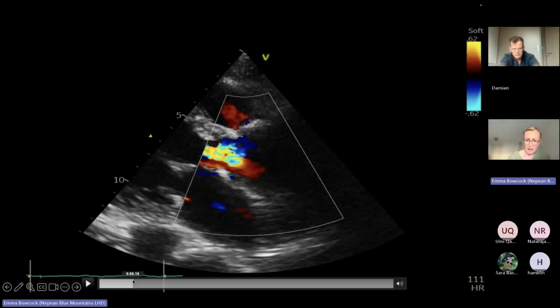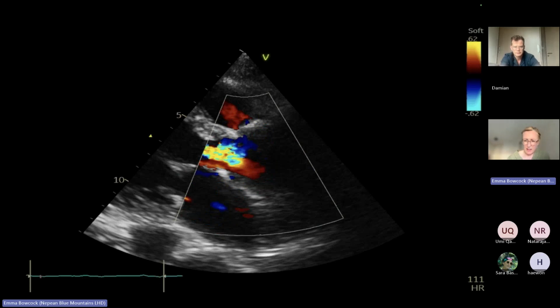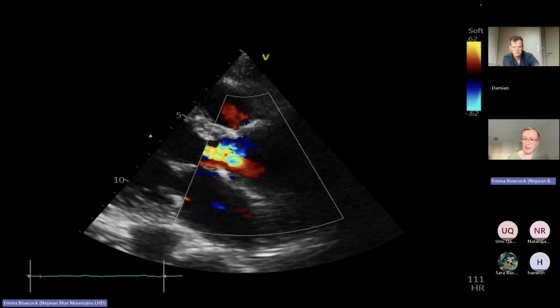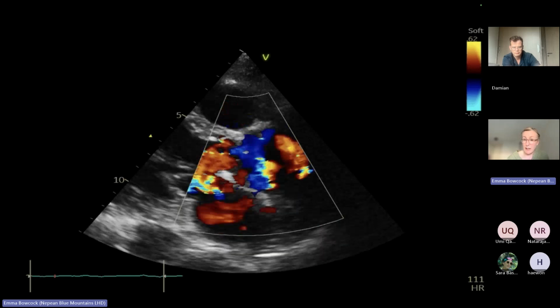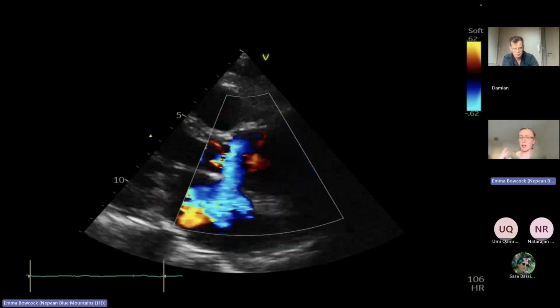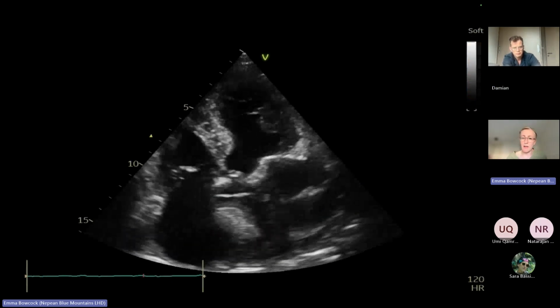So there in diastole, you've got that flow convergence. It's sort of eccentric and chaotic and a bit all over the place, isn't it? It's filling a lot of the LVOT, more than 65%. The vena contracta, as you said, does look broad, and you're worried about dissection, right? So you're thinking already that this could be AR associated with the dissection. Obviously, you're going to start looking for other things that you get with dissection. So you can get AR, you can get regional wall changes if you've dissected down into your coronaries. You can get pericardial effusions, you can get pleural effusions. So you'd be looking for those things as well, just to complete the picture. I know we're focusing on the AR in this particular stem.